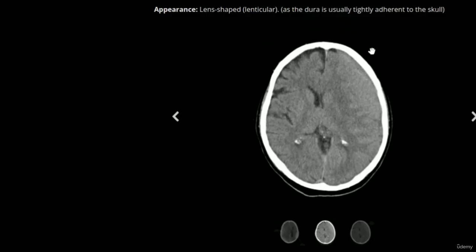Another case here of epidural hematoma, if we see here, we have this loss of differentiation between the white and gray matter, and also the midline shift and the shift of ventricles. And here we have epidural hematoma in the subacute phase because we have the gray, as we say, in the subacute phase we have the hematoma in gray.